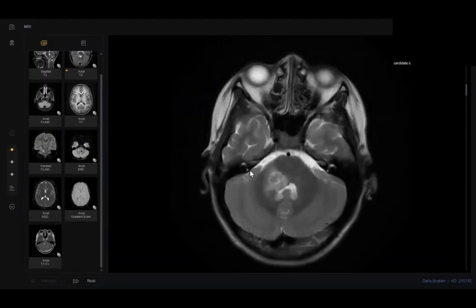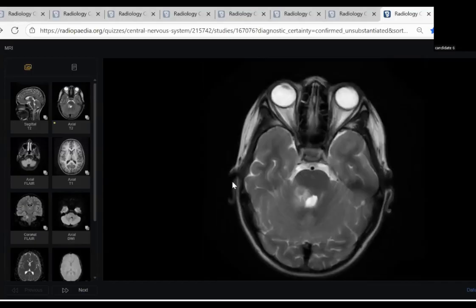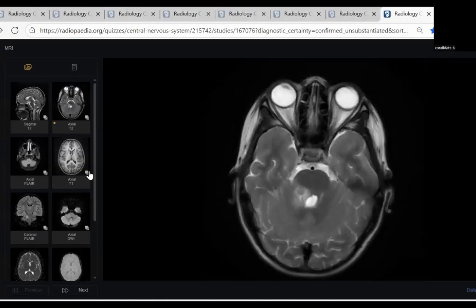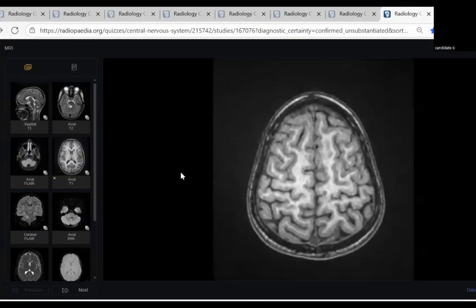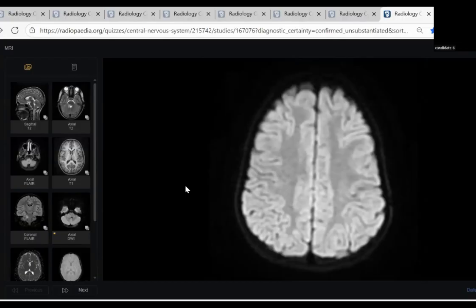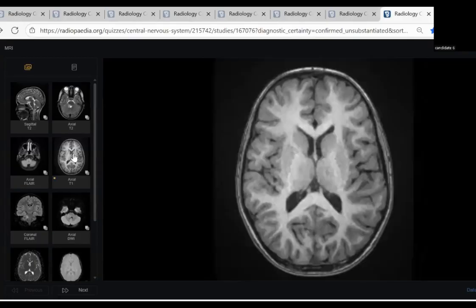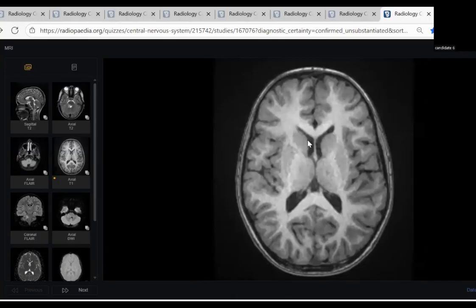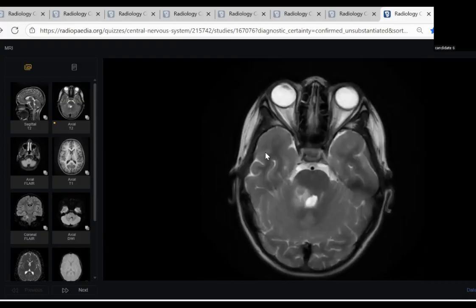Okay, my colleague, so that reveals the importance of conventional sequences. Very important to look, especially in brain. In T2, to rule out tuberculoma, and in T1, generally to rule out any hemorrhage. Very important. If the examiner guides you, saying show this, please, look at this slide, he is helping you too much. But if the examiner leaves you generally with the sequences, take it one by one: T1, T2, FLAIR. In my opinion, T1 is more critical than FLAIR because you can detect hemorrhage. T2 is very critical in a ring-enhancing lesion to rule out tuberculoma.